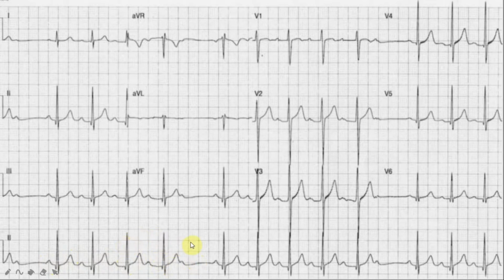Now, what is different is a couple of things. Here this is 5:4, but here there is one P wave followed by a QRS complex, a second, a third, a fourth, a fifth P wave followed by a QRS complex, and then a sixth P wave. So this is a 6:5 atrioventricular block, or heart block. So still it is a Mobitz type 1 atrioventricular block.